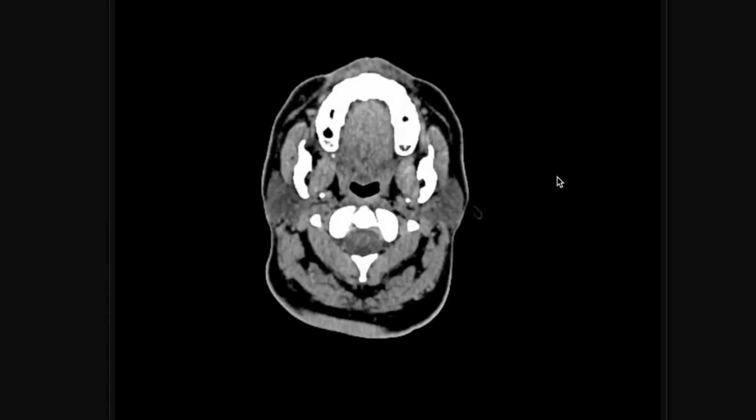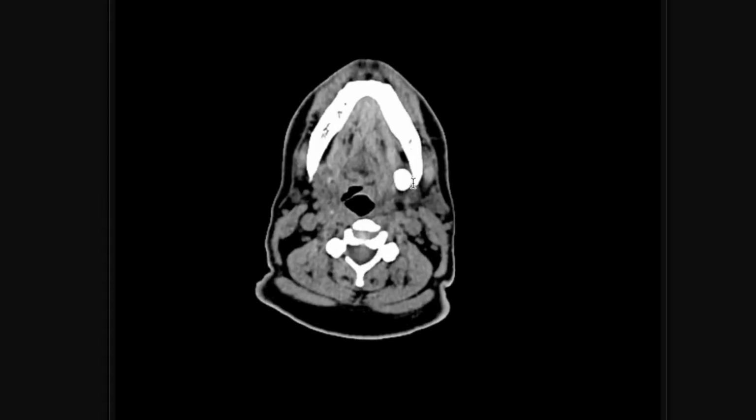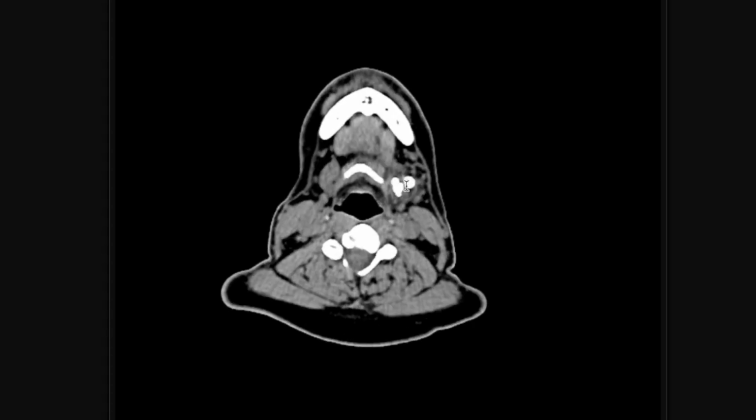If we check this axial CT, we can determine something very surprising and shocking. Now those radiopacities can be narrowed down to calculi. The upper region demonstrates protrusion out from the gland. The mid-region calculi, if I focus on it right here, demonstrates that it is protruded on the lateral aspect of the gland, and the inferiormost calculi portion is located within the gland itself.